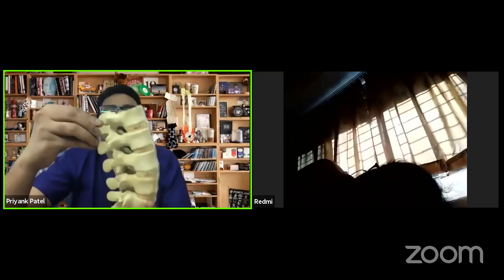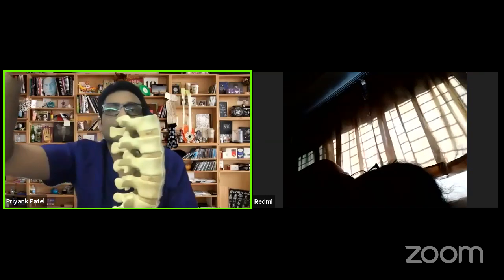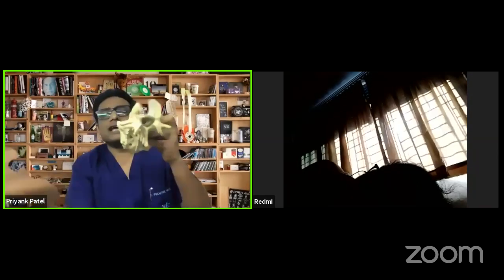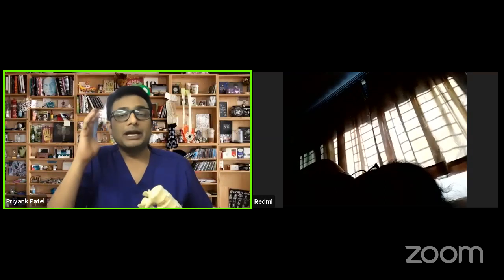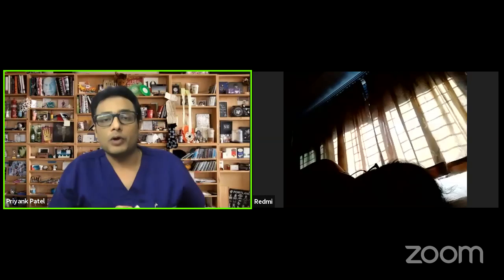So you get the sagittal plane and the axial plane, and the sections are cut at particular intervals. A sagittal section will be a cut taken here, and from the rightmost part it starts cutting the body into the leftmost part, and axial sections are cut from the topmost part of the body to the bottommost part. By seeing different sections at different places, after some time you will be able to 3D visualize exactly which part of the spine is creating a problem.